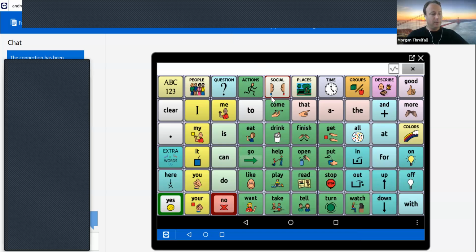Well, that's all of the settings, so I'll turn the video recording off.